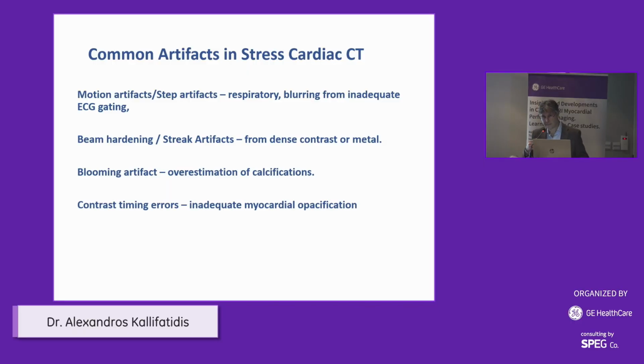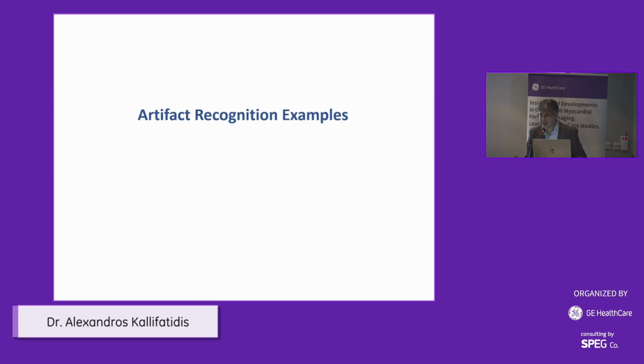Here we can see some common artifacts in stress cardiac CT, also related with motion and step artifacts, beam hardening and streak artifacts, blooming artifacts, and contrast timing errors.